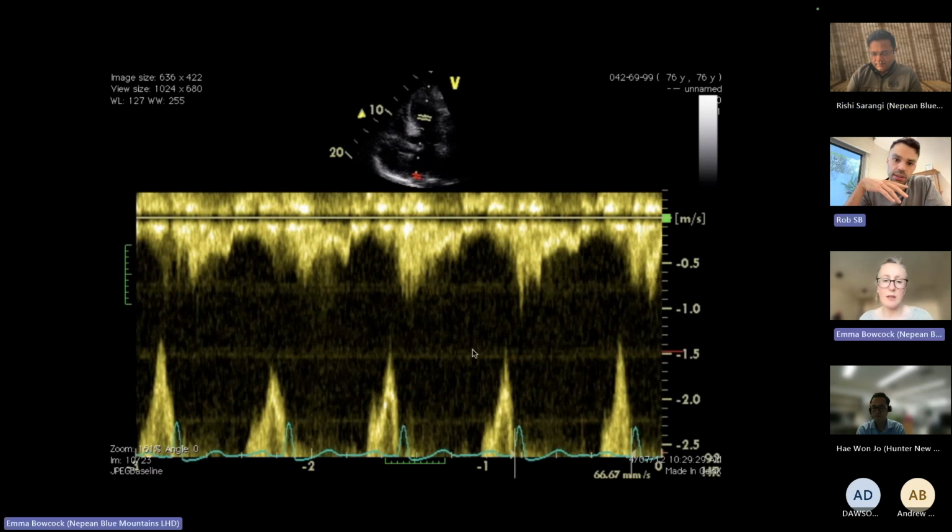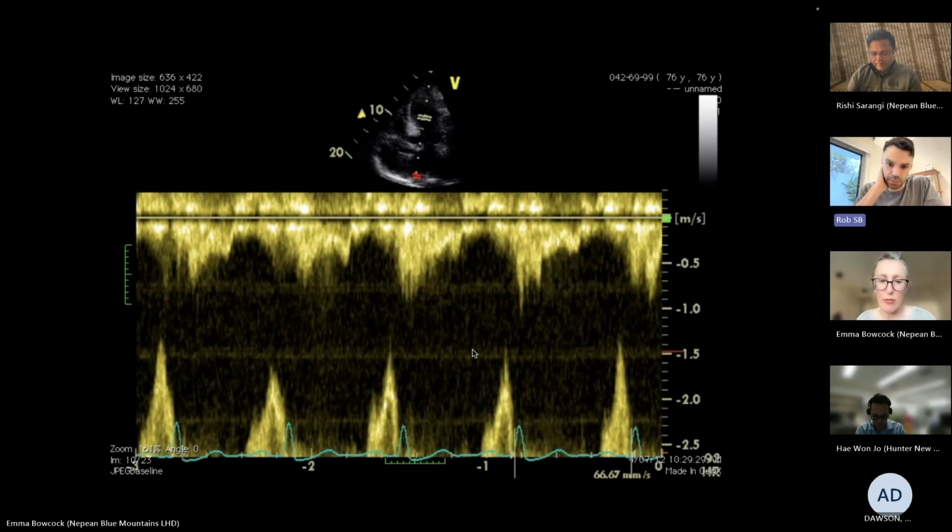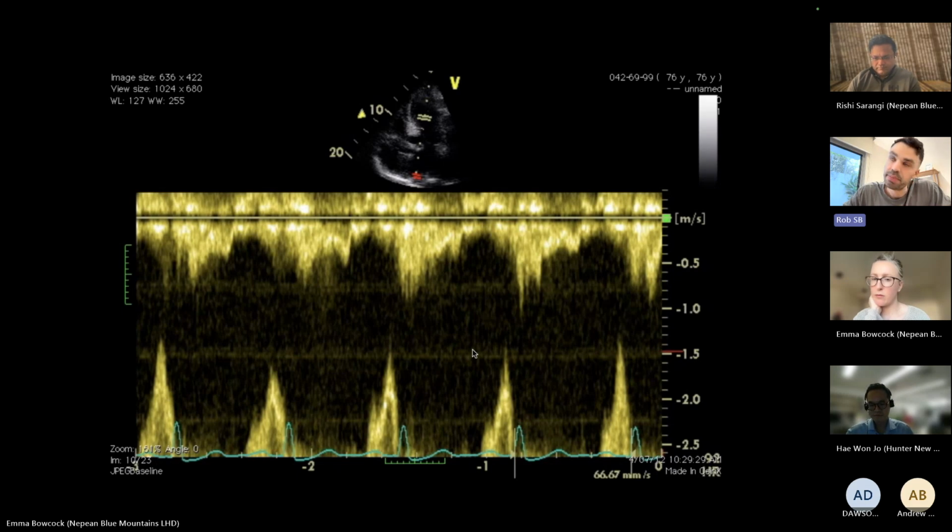This is again pulsed wave Doppler, but more toward the mid cavity. So there are two traces here. Again, there is some aliasing occurring, which is probably capturing some inflow into the left ventricle, but then there is the trace which is heading towards the LVOT. It's showing a sort of mid-systolic notch that can happen with mid-cavity obstruction.